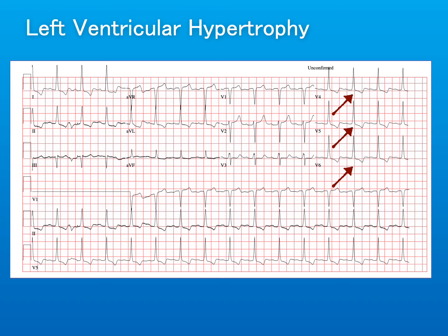We often also see negative QRS waves in leads V2 and also lead 3. So in these cases as well, if you have a predominantly negative QRS complex and a negative T wave, it's not T wave inversion. Like ST depression, T wave inversions are a relatively non-specific finding, and a real T wave inversion, what it represents is abnormal ventricular repolarization, which you can also see in other conditions like left ventricular hypertrophy, for example.